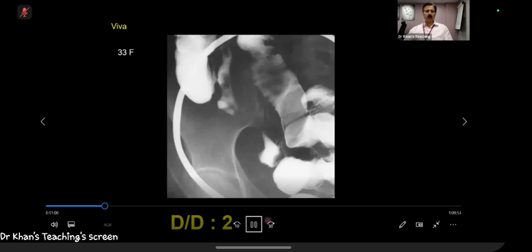So, and when we will cover ulcerative colitis, there you will understand that ulcerative colitis is only superficial ulceration. Now, skip lesions is another thing which is quite pathognomonic for Crohn's disease. So, skip lesions means that there will be areas which are normal. Now, what is happening here is that there is a stricture which looks close to a fibrotic stricture and very smooth.